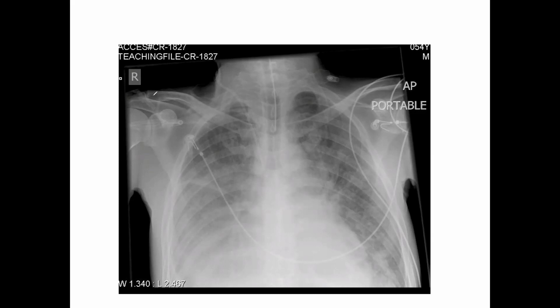This is the right side of the patient over here. But we do see a couple of things. You can make out the heart. You can see the heart is oriented just as it should. The aortic arch, aortic knob. You can see the trachea. The trachea bifurcates into your right main stem bronchus and the left main stem bronchus. So we're looking at our hilar region here. The carina, I'll put a dot right on where the carina is at. The carina is there. Hopefully you can pick that out.